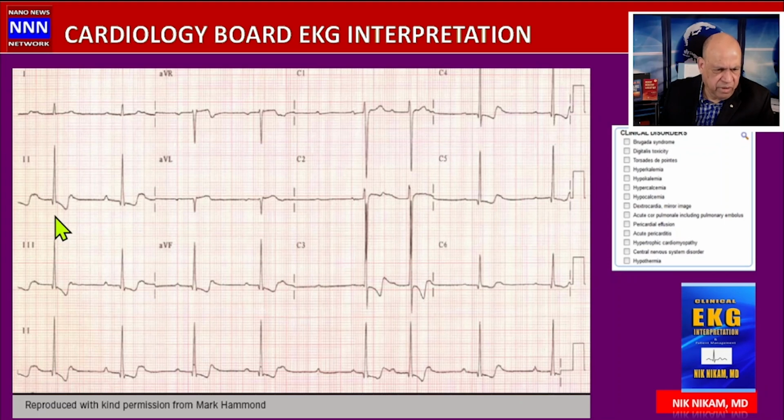And here's an example of a sinus rhythm with this J point depression, this sagging ST segment, T wave inversion, and a biphasic T wave, so this could be evidence of digitalis toxicity, and it's usually confirmed by the serum digoxin level. Basically, you just have to reduce the dose or stop it altogether to get rid of arrhythmias related to digitalis toxicity, which may be more harmful than giving any benefit.